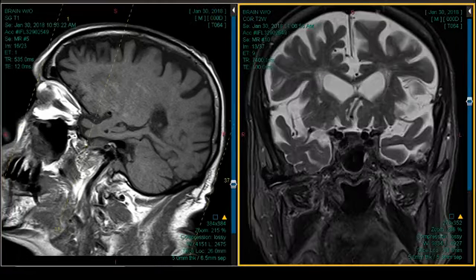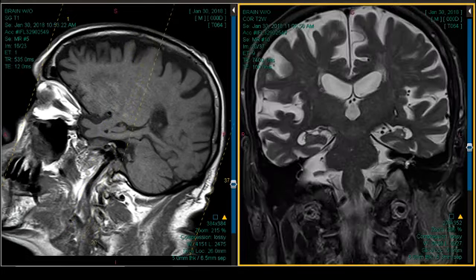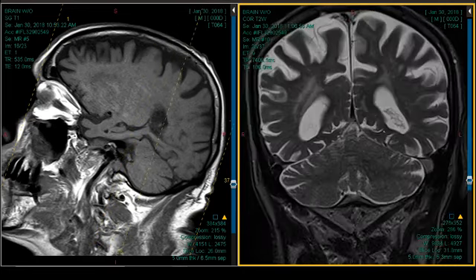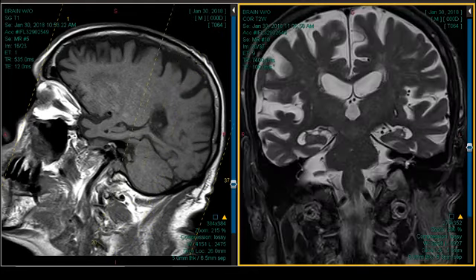And now let's go to the coronal and look at the choroidal fissures. They're huge. The temporal horns are huge. Now this time, there's no doubt. The entorhinal cortex, everything mesial to the choroidal fissure, it's just flatter than the instep of a duck. It's just straight flat across. Look at this side. Straight flat across. It looks like a moose, right? Without the horn, without the antler. There's the moose's nose right there. And massive choroidal fissure atrophy. So I think this one would be a good candidate for ALZ. Correct.